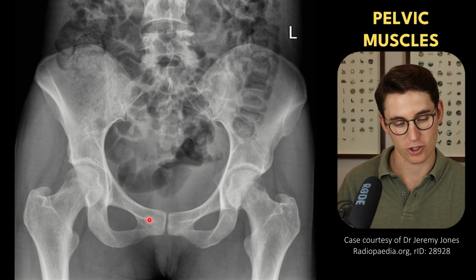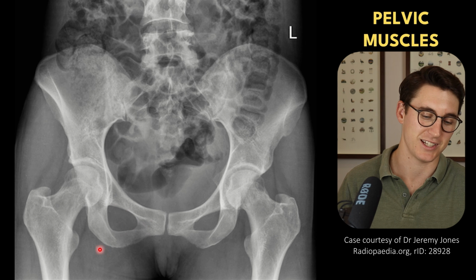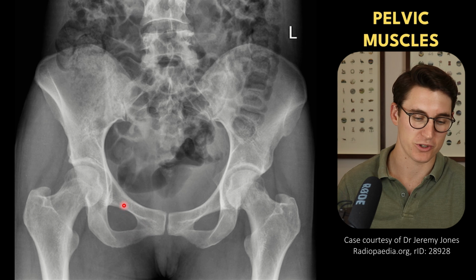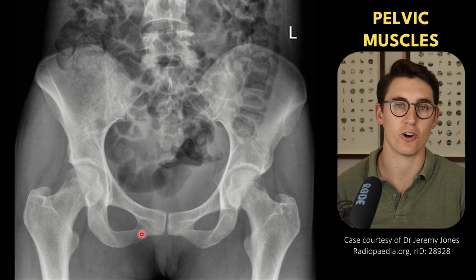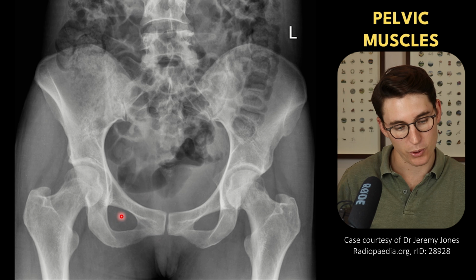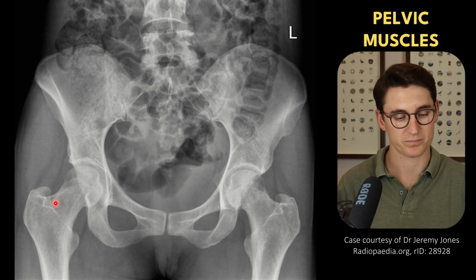Then we can think about this obturator foramen that's created by the superior pubic ramus and inferior pubic ramus. And on the internal surface of that obturator foramen, we have what's known as our obturator internus. It's coming from the inside of the pelvis, heading posteriorly behind the neck of the femur here, behind the ischium here, and heading towards our greater trochanter there.